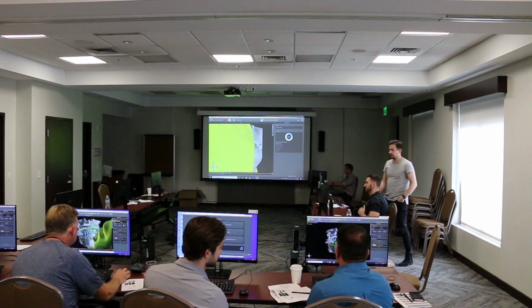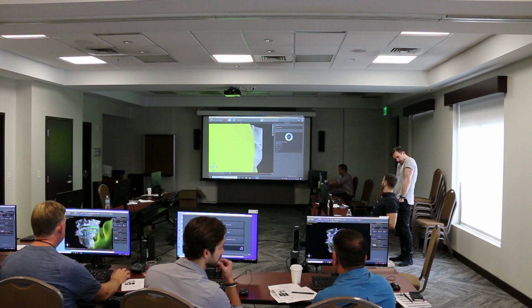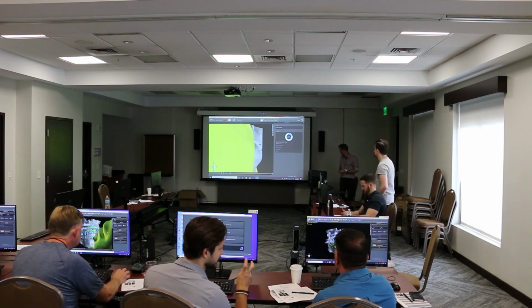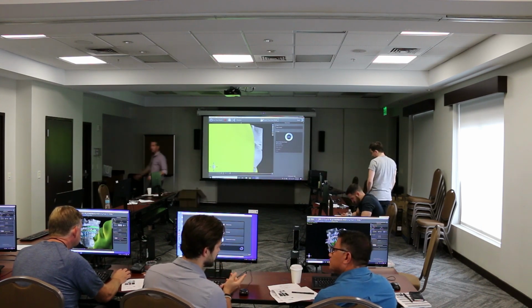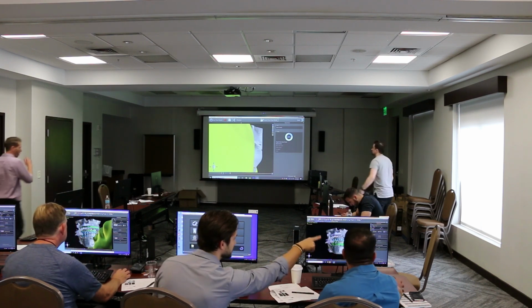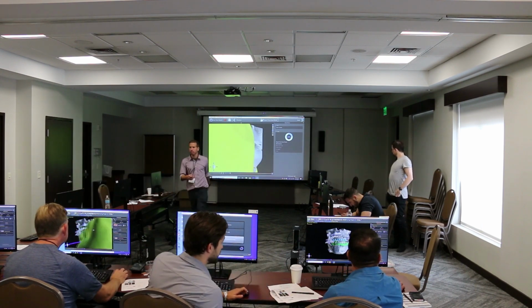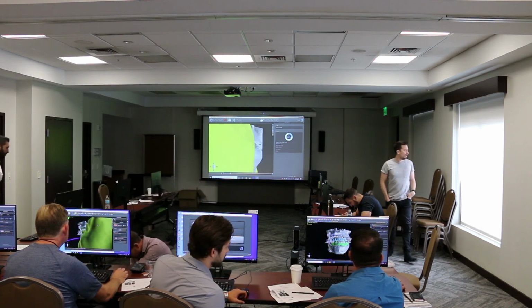Okay. So right now, what I see the issue is, we're off the line of the iTero upper scan. Do you remember how to get the upper iTero scan stitching to the CBCT? No. Okay, so do you see the pattern to the right? Yeah. So first, if we're working with the upper jaw, you can see the upper jaw, right? So that's the blue model.